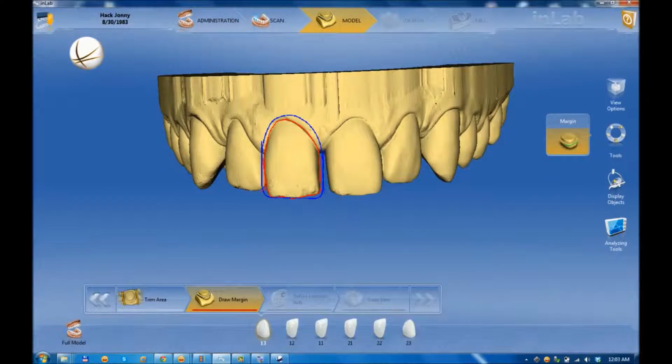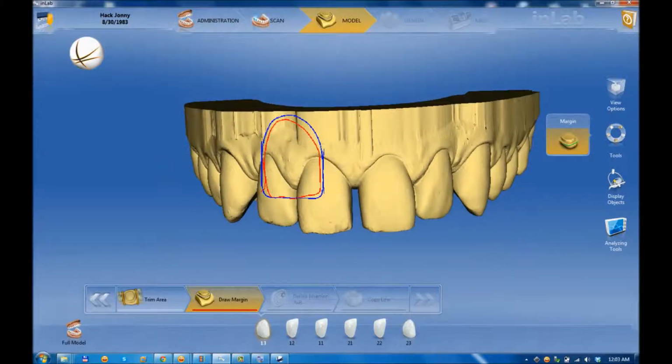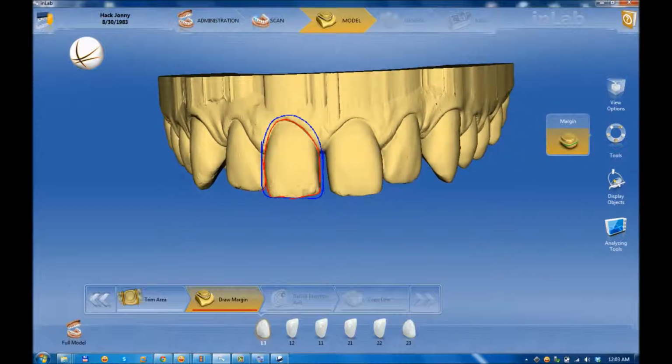If the 3D model is accidentally moved from the position used during the calibration, the undo function of the DSD Connect software can order the application with which it is connected to replace the 3D model in the initial position simply by pressing the Z button of the keyboard.